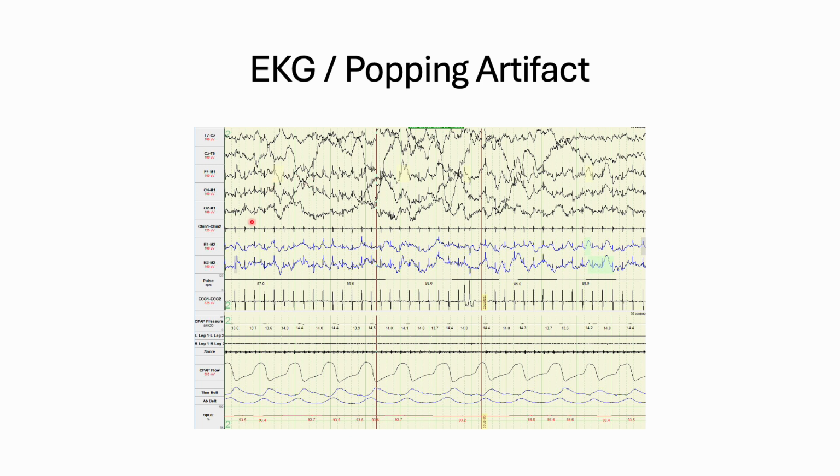They all have it, and the eyes have it as well. So I think this is probably going to be from the M's. Individual F's, C's and O's are not going to have this kind of EKG artifact. It's going to come more from the M's. You also have lots of it in the chin.